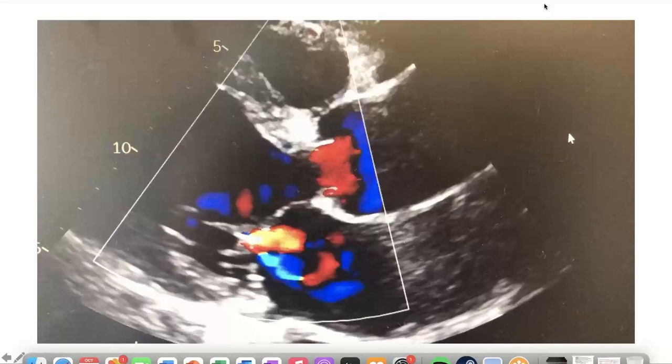Because remember, what often generates the aortic incompetence here is either dilatation at the sinotubular junction or at the aortic root. Dilatation at the sinus level does not then cause displacement of the aortic leaflets, and that won't generate central AR. So it's really all about the root and the sinotubular junction that will then lead to central AI. So if it's not central, then you've got to think about, well, is there another mechanism that has led to the aortic incompetence there? And obviously this is where it's super important that we sit down and chat with the surgeon so that we can help appropriately plan.